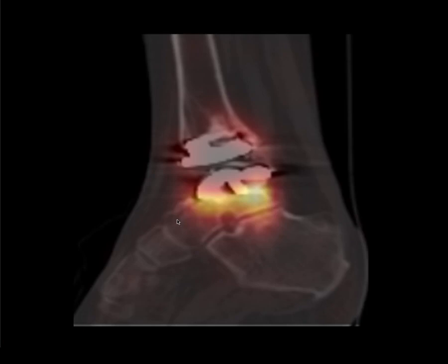The other advantage we have when we're performing this examination, or one of the things we might be looking for, is can we identify degenerative change at other joints, perhaps the subtalar joint or the midfoot joints, because occasionally a total ankle replacement can alter the biomechanics in the foot, and the patient may develop rapid degenerative change at another joint due to altered loading within the foot. So if the patient has a painful joint, it would be very helpful to identify that, because if the problem is coming from another joint in the foot, a redo of the replacement would clearly be of no help. So we can see a nice subtalar joint here, no abnormal activity in that.